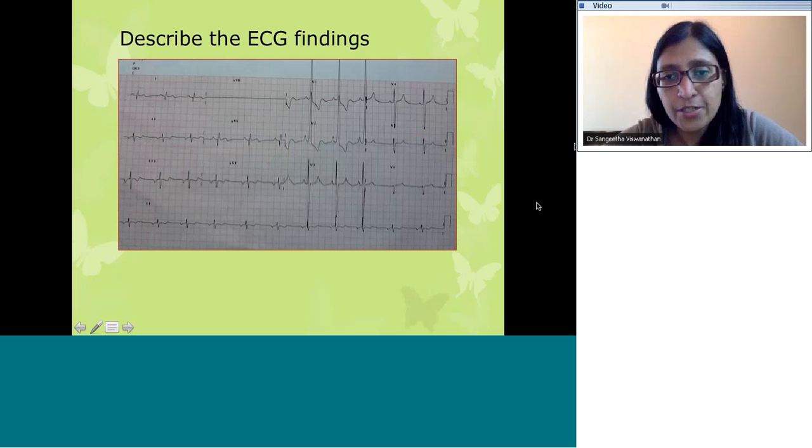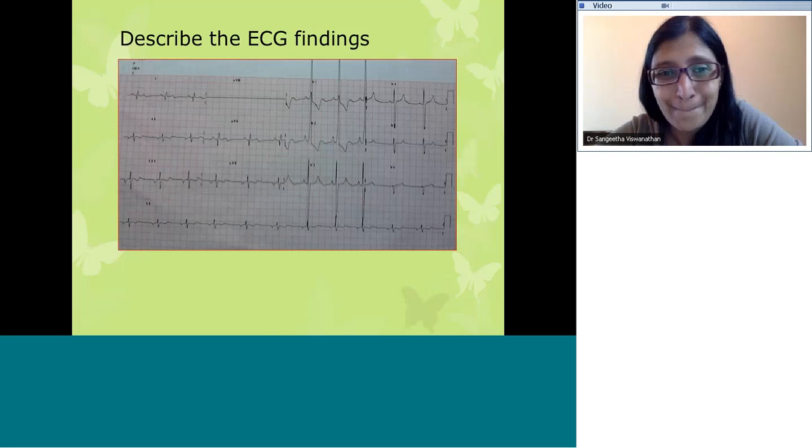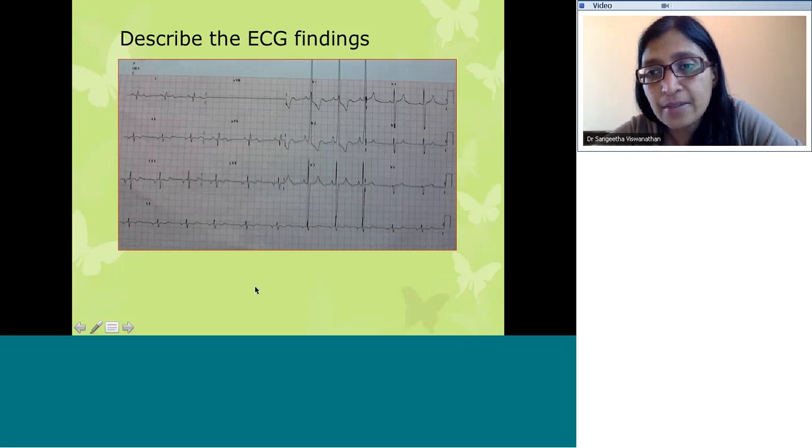This is his ECG. What are the ECG findings? He's 10. What are the ECG findings?